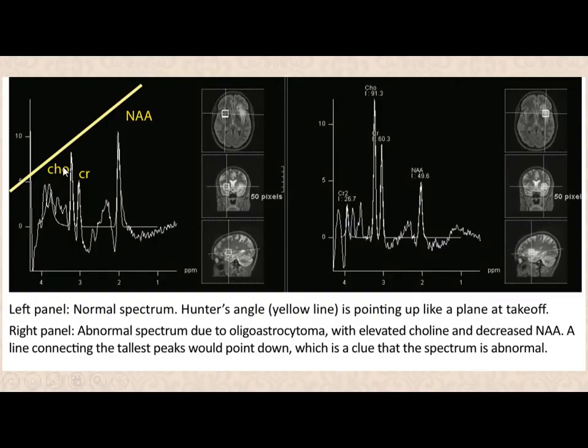We have this spectrum. You can see the NAA is high. And this is the creatine, the standard, and the choline is also higher than the creatine but a little bit less than NAA. And while we see here, the NAA is much reduced and lactate increased, indicating there's cell death, while you see the creatine is fixed, the choline is higher, indicating what? Increased cell turnover. So it can help you to decide which kind of pathology that is.